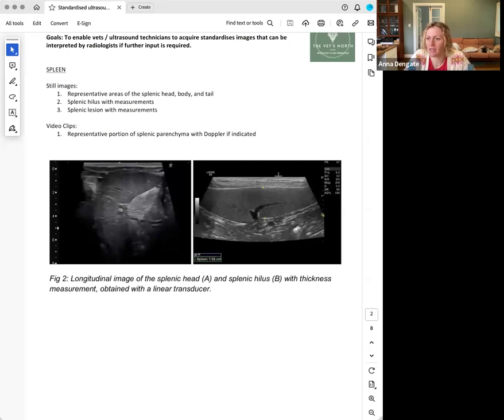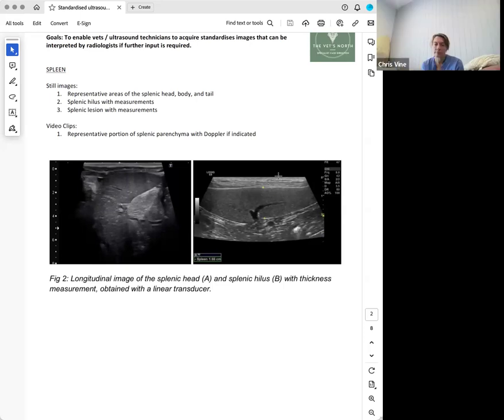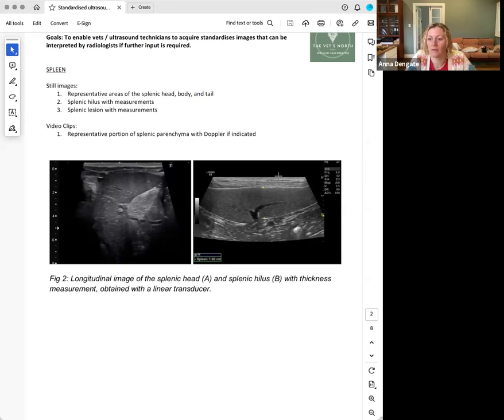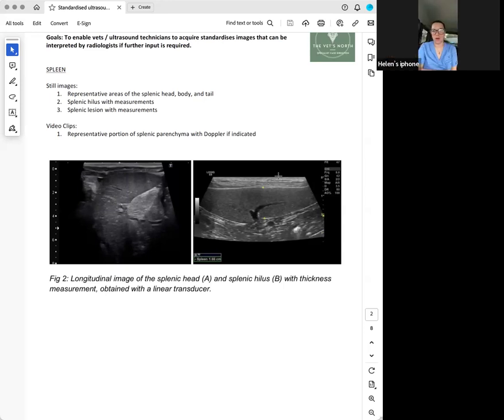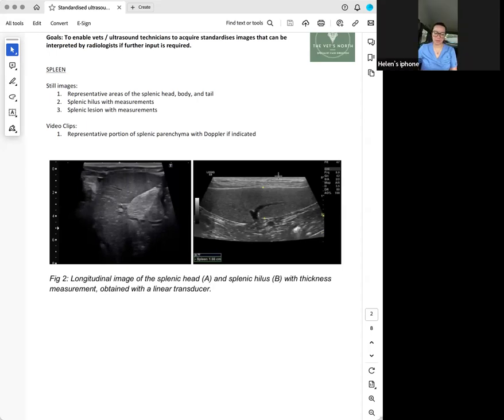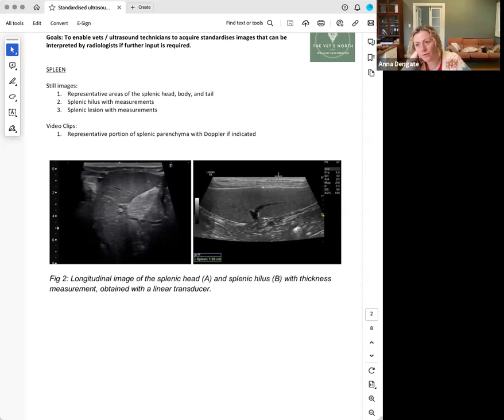What else are we assessing other than size with the spleen? The same as we spoke about with the liver, the echo texture being quite important. Yeah, so whether there are focal masses and describing the echo texture of them, or whether it's a diffuse change. Exactly. And what sort of typical changes will we see with certain sedations? Splenomegaly and a bit of a congested spleen. Yeah, good. Which sedations?